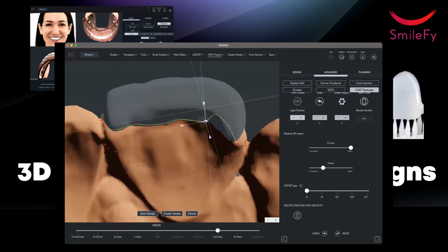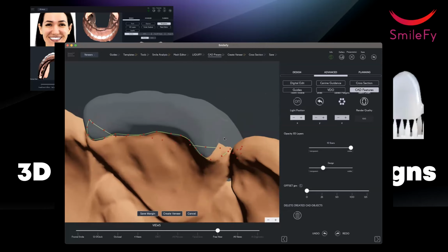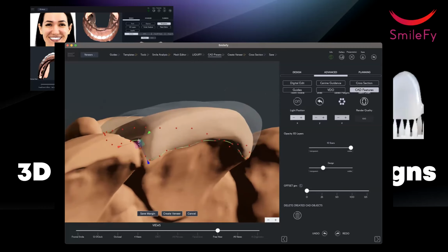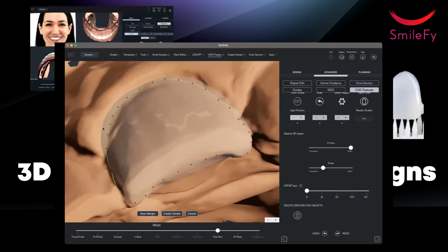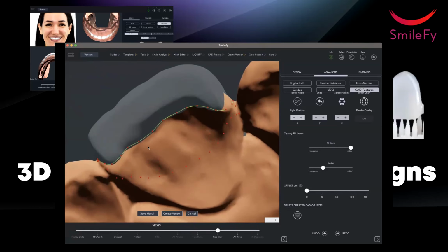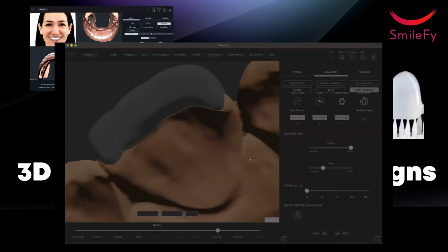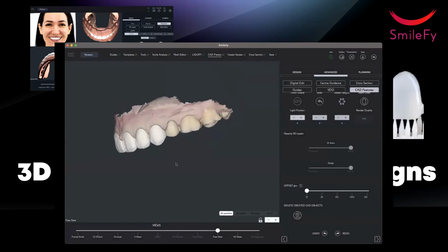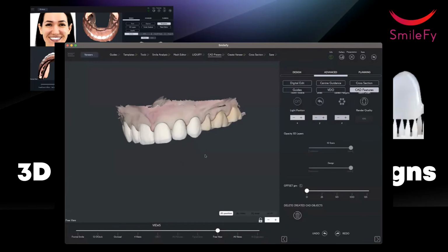I'm gonna save, of course, the margin so that we don't need to reload or reset the margins again. Let me see. That's good. Okay, so we need to take care of this area there. Okay, save margin, margin saved. Back to the design. What did I do? Let's see.